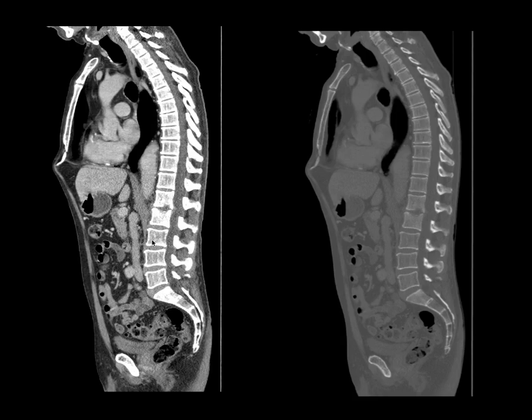The same here, but here you can see there's marked irregularity at the adjacent end plates, and we can see it here on the bone windows as well, and this appearance would be highly suspicious for discitis or septic discitis, infective discitis, spinal infection essentially. This is the classic appearance.